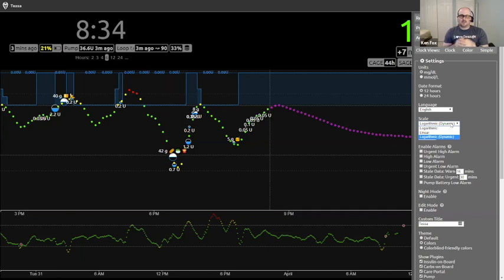So logarithmic, or dynamic, is going to give you a bigger spread where most of the dots are in the middle, hopefully, so you can see the differences better. But as you get to the fringes, the dots will get a little more compressed. They might be 10 points apart from each other, but they'll look really close together. So if you want a nice evenly spaced graph, you would change it to linear. It would make everything more even.